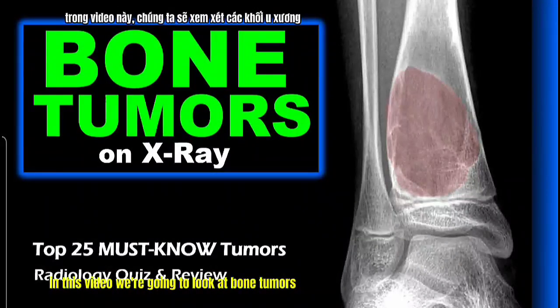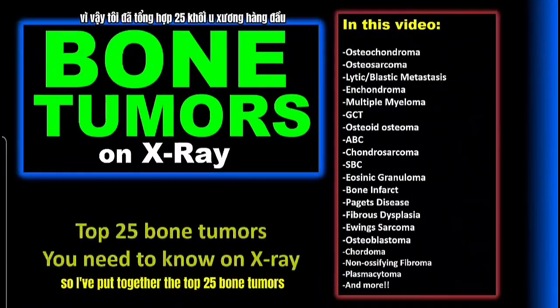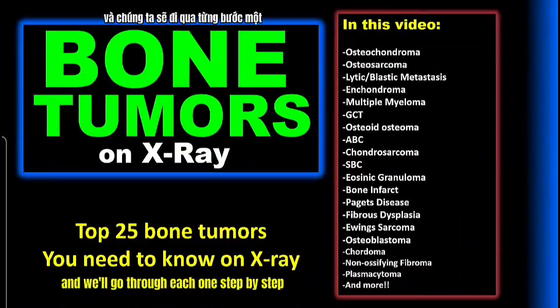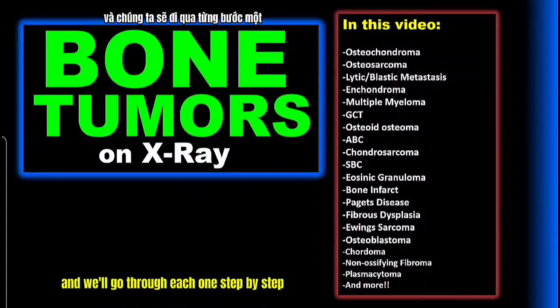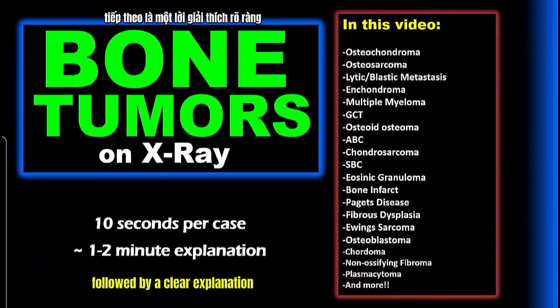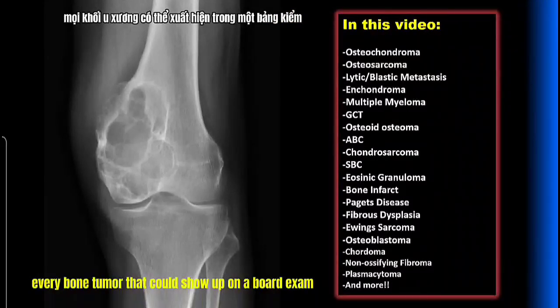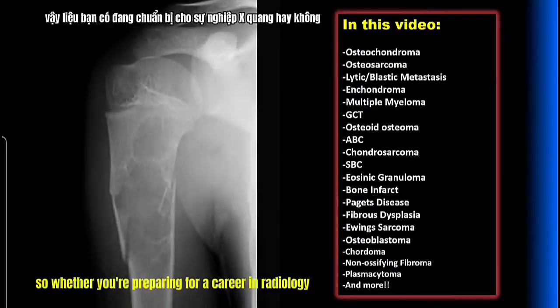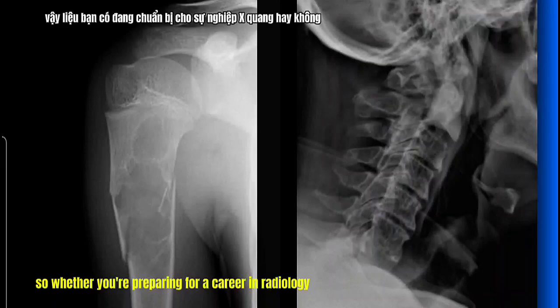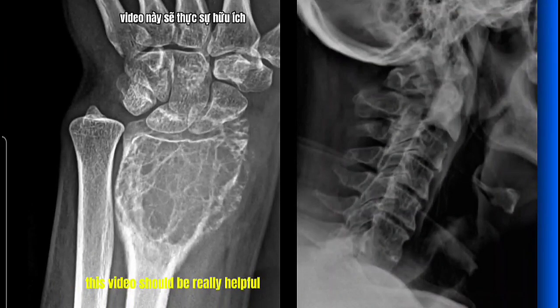In this video, we're going to look at bone tumors. So I've put together the top 25 bone tumors you need to know on X-ray, and we'll go through each one step by step. You'll get about 10 seconds to review each case, followed by a clear explanation. Every bone tumor that could show up on a board exam is included. So whether you're preparing for a career in radiology or you just want to test your diagnostic skills, this video should be really helpful.